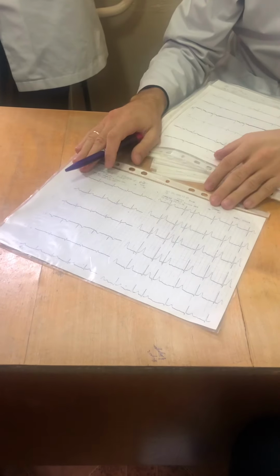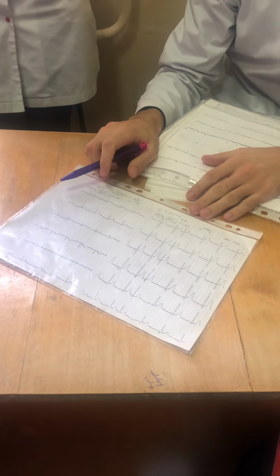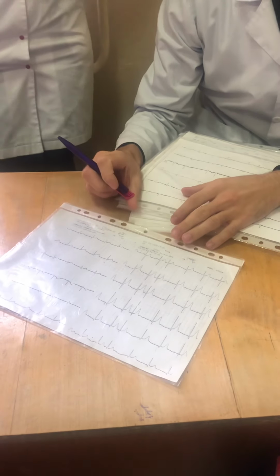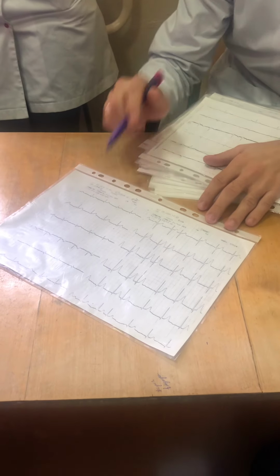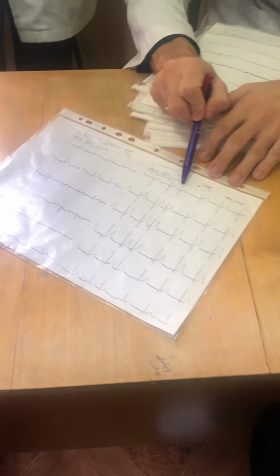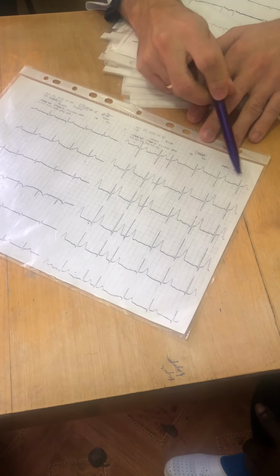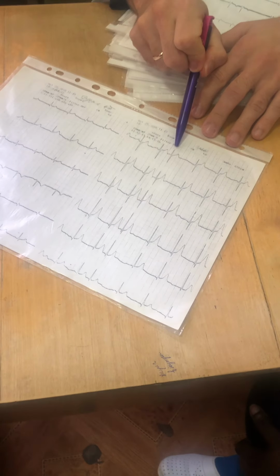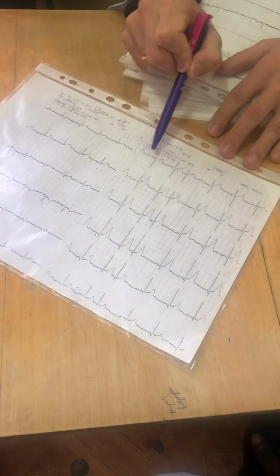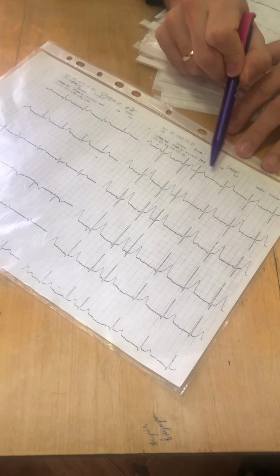You remember the steps of how to check an ECG, I hope. I will show you just the pathology to do it faster. You can see a short distance here, a long distance here, and arrhythmia. This one is extrasystole, because there is a very close distance here, closer than normal, and a long pause after this.